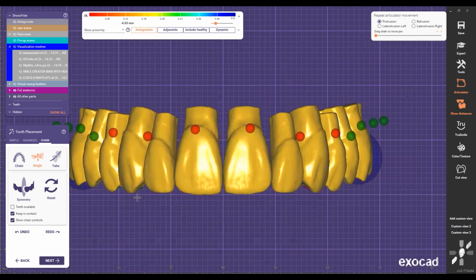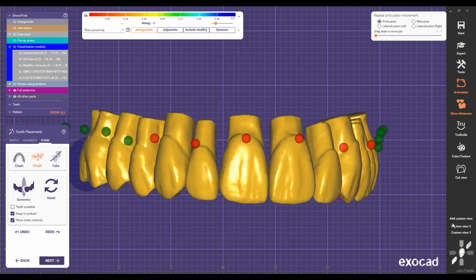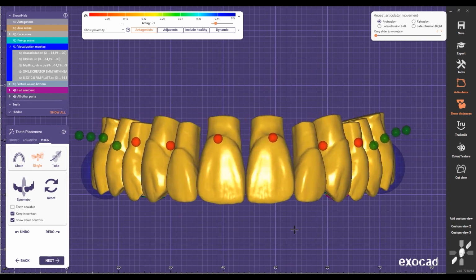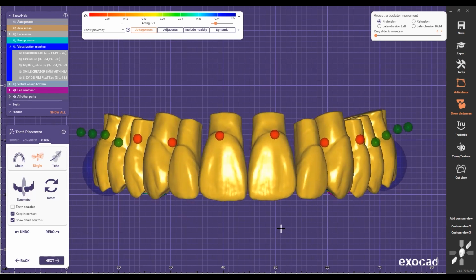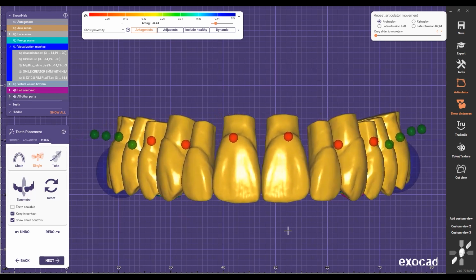The background line here, the horizontal plane, and I'm just gonna do the same thing here. I'm gonna do this, looks good. Perfect, let's go down. Everything is there. Remember, this is kind of like the base plate on the articulator when the guys are setting up the teeth, right? You have a base and then they set it up so the way everything looks flat, all the cusps follow the plane of that base on the articulator. Same concept here, okay? So that's why I like to bring those ideas and digitize them and apply them here. So now I'm gonna go to this one, the molar, and I'm just gonna do this.